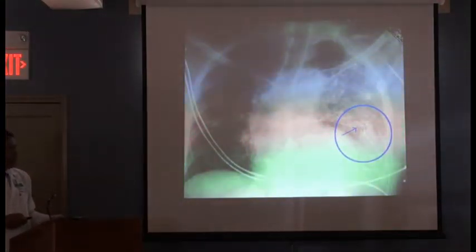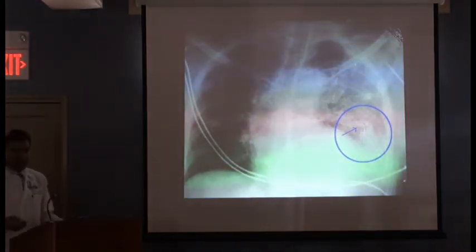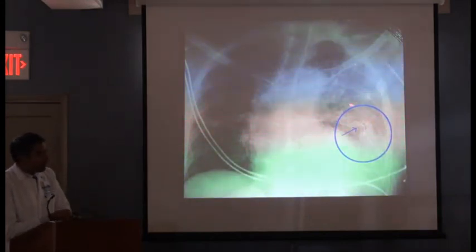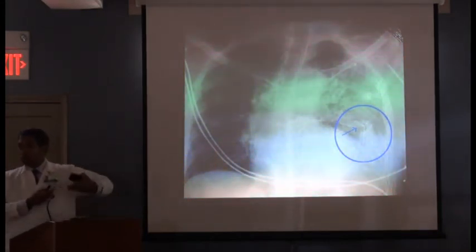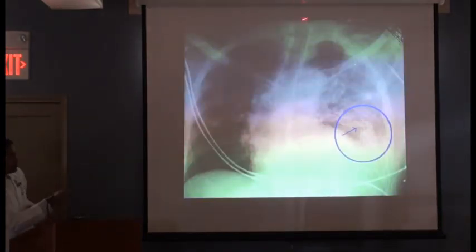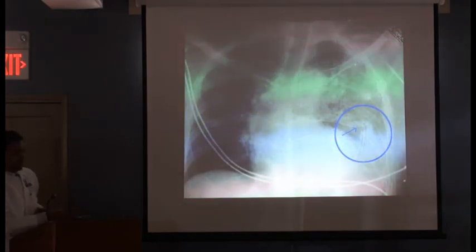We put an NG tube down. We see it curled up over here, and in fact, we see a diaphragmatic rupture. There's also probably a contusion here, but it's also probably atelectasis because now everything's being pushed up. What you're seeing back here is the lung being pushed up, giving you atelectasis, and this is probably intra-abdominal contents, specifically stomach. And there's the NG tube curling up in there.